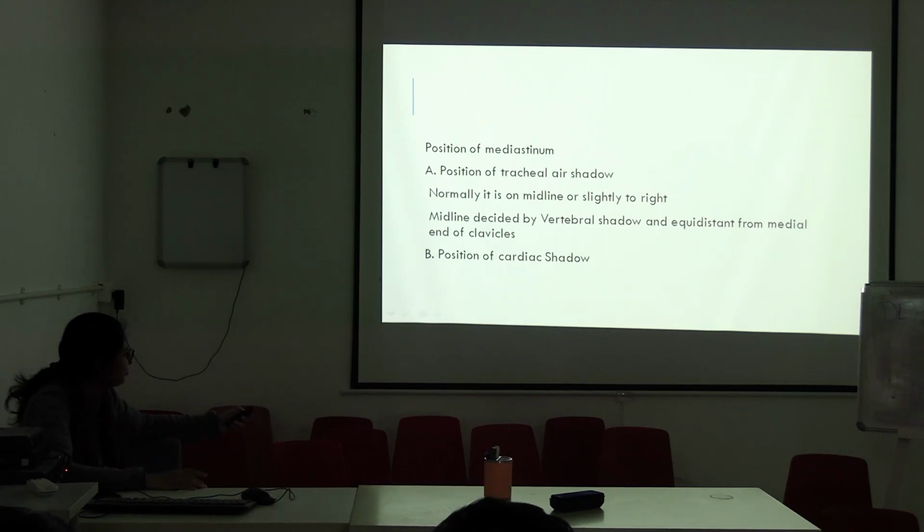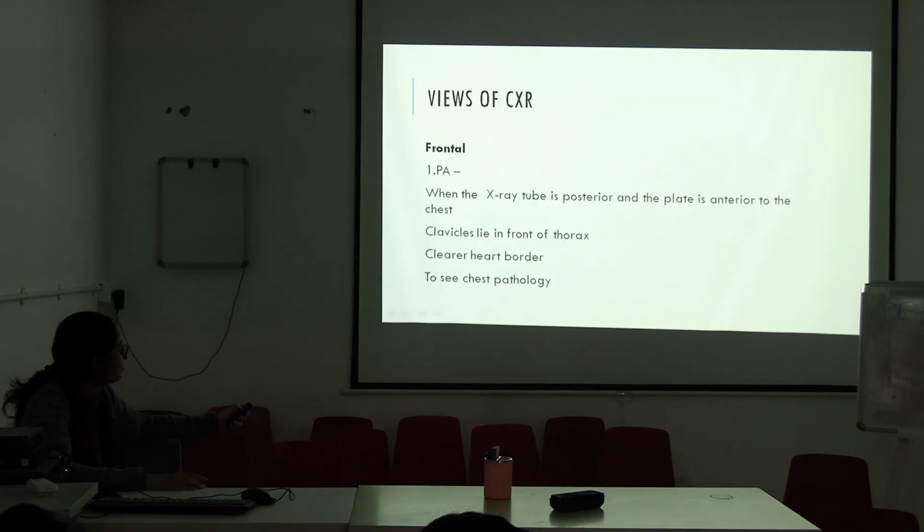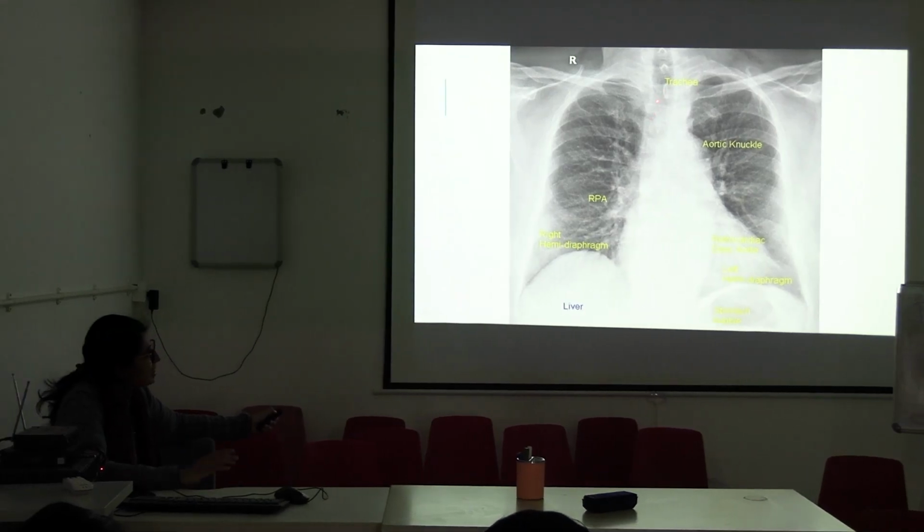Okay? So look at this again in the beginning. Trachea is almost in the midline and slightly to the right also you can say. Yes, and again cardiac shadow is normal in position.